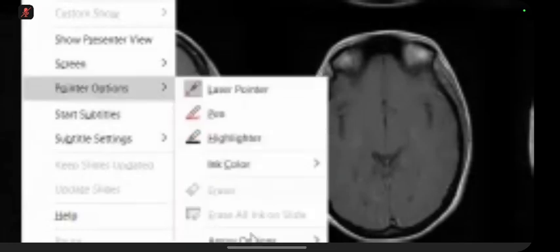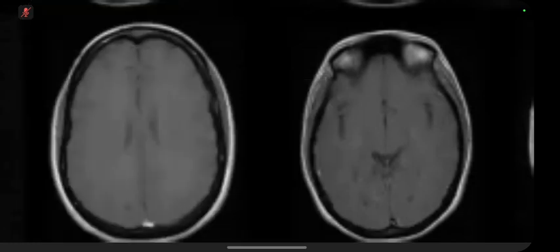Okay, maybe you cannot see it because it is a very small image, right? Do you see this enhancement here? Do you see this thing? Yeah. So actually there is enhancement, do you see this enhancement? Yeah. So some of these areas are also, for example, if you tally this with this, there is a bit of restriction also. So the point is, can this be MS? Can you diagnose it as MS? Confirm it. First presentation.